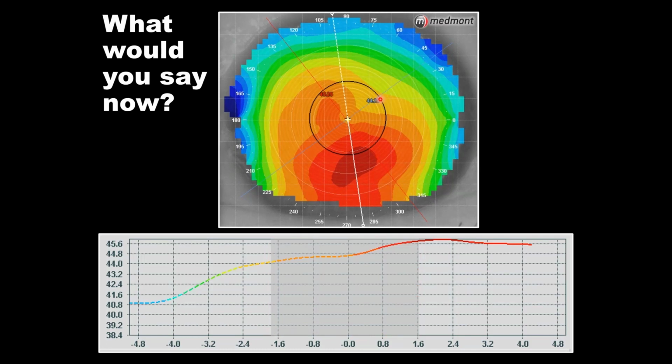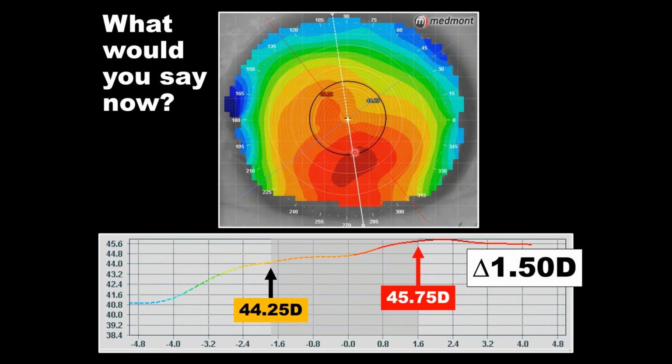What about in the steepest and most asymmetric meridian? Let's again focus in on that pupil area. And going north, we read about 44.25 in the superior pupil. Going south, about 45.75. So basically, we're clicking on this point and this point to determine what is the power spread across the pupil. And there's really only 1.5 diopters of power distributed across this eye. That's not so significant. One would presume that that's pretty common in the population, and therefore good quality of vision should be possible for this patient.